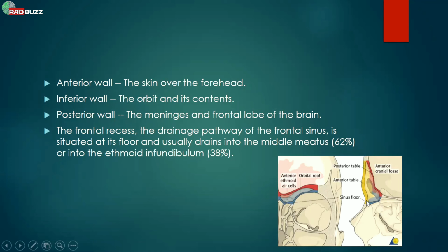In the sagittal, we can see this is nose, that's the brain interiorly. So that's frontal bone. This is the anterior table or the outer table, and that's the posterior inner table, the red one. So posterior to this is the brain parenchyma, anterior to this is the skin. So we have anteriorly the skin and forehead.